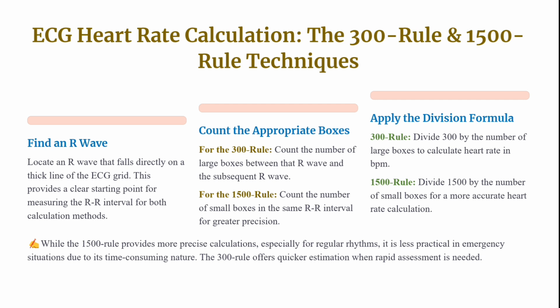Methods for determining heart rate on an ECG. Calculating heart rate from an ECG is a fundamental step in rhythm analysis.